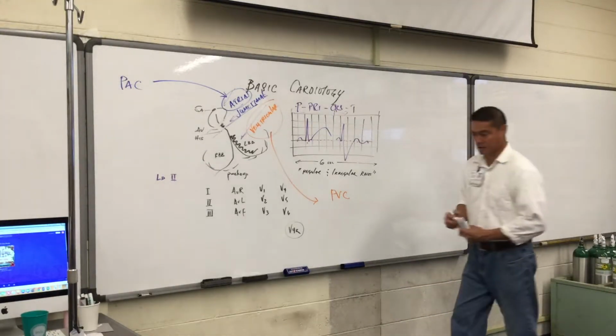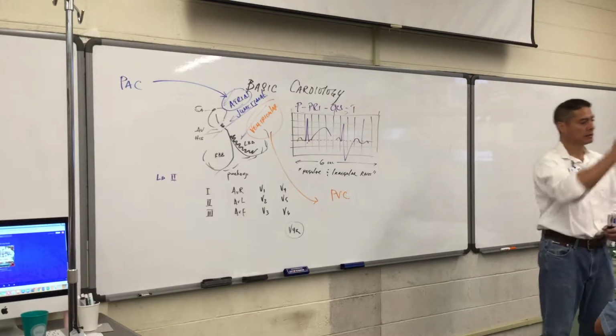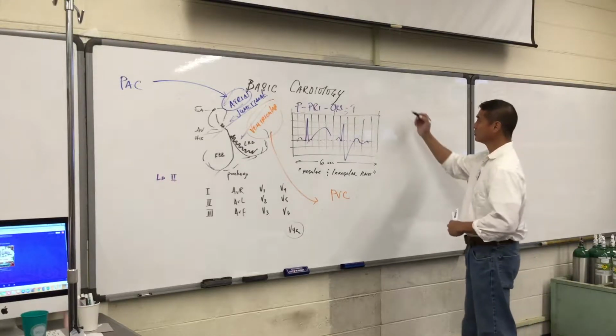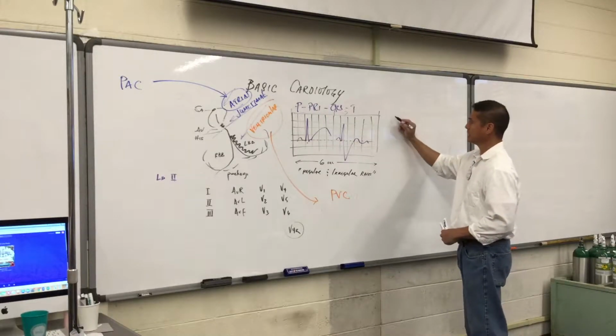Okay, so let's take a look at some of the criteria that we're going to start to use as far as looking at an EKG strip. Some of you already should have. We printed out 4 of these yesterday. So look at what we're looking for. There are some rules, so we're going to follow this in a linear fashion when we start looking at EKG rhythms.